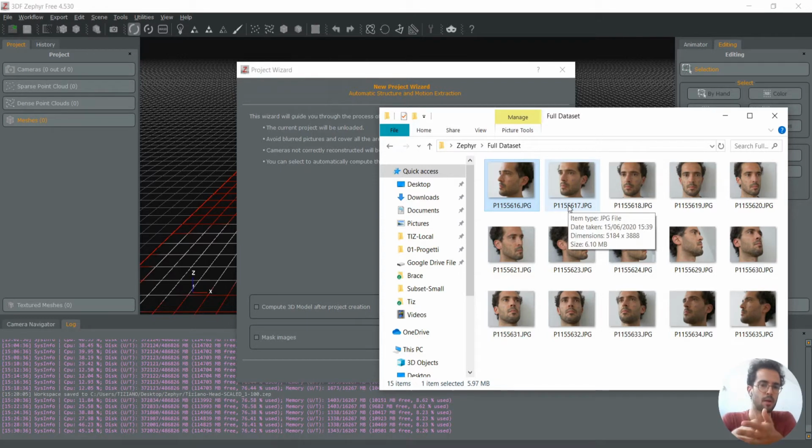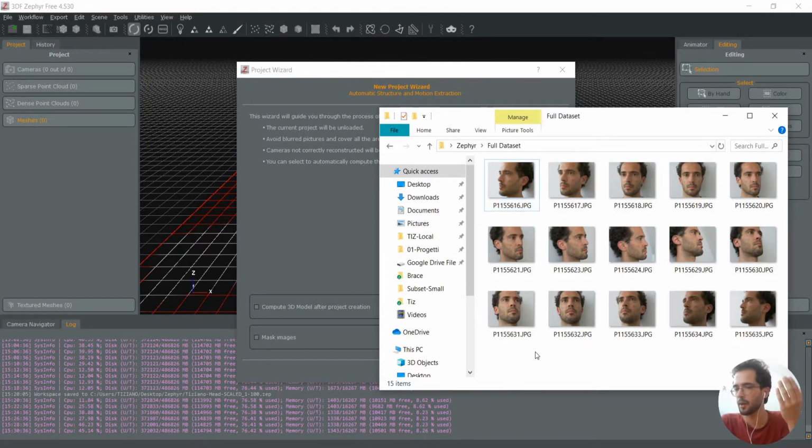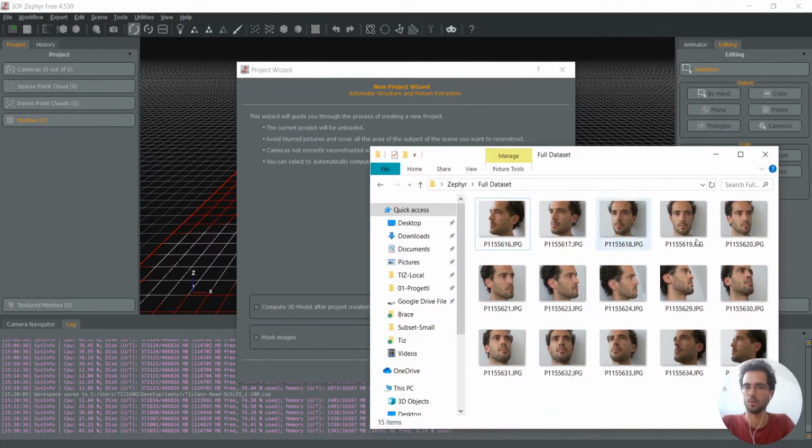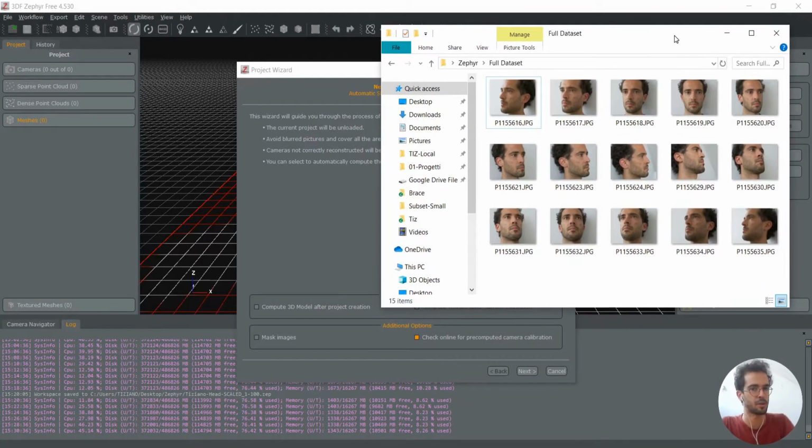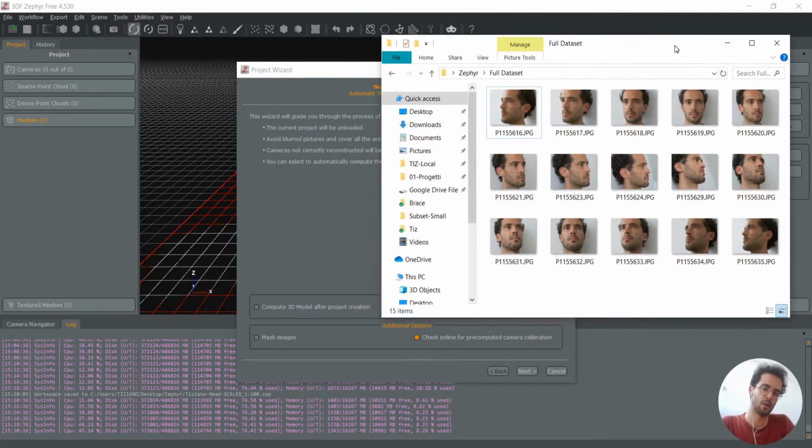So it's similar to a photo taken with a pinhole camera, which is an older way to make photographic machines, and it's closer to a geometric projection of points compared to a system based on lens. So the camera distortion is corrected to get the photo right at the beginning. You can have some problems if you use a really old photographic machine or a really new one.